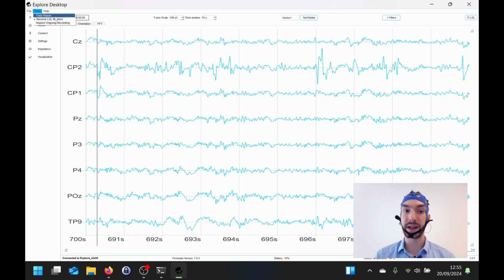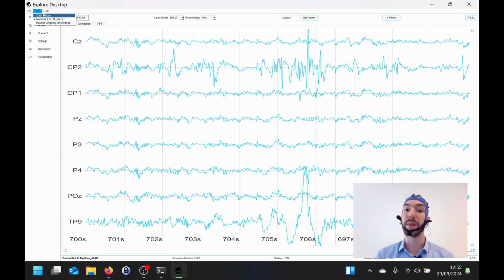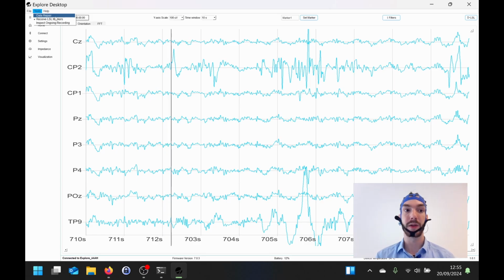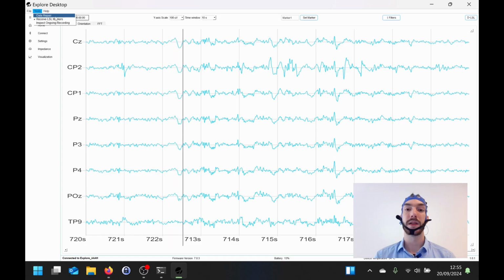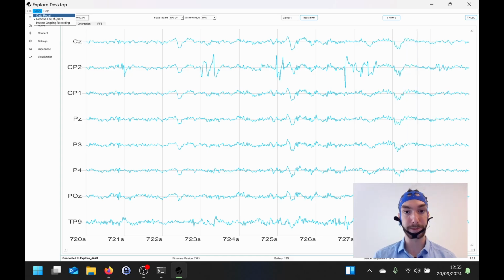The binary file has recorded everything that has happened and there won't be any loss, but it could be that because of a bad Bluetooth connection, the end device could not record everything. What will happen is that the binary file will be used to stitch back together the CSV file. The CSV file differs from the binary file in that it also records the virtual markers.